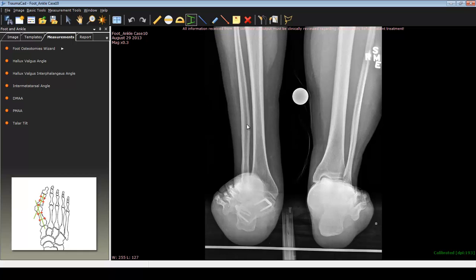So if you select the interline angle, let's look at the normal side. If you click on the normal side, you would see that there are certain measurements that are important when you're looking at this image, and that normally involves taking the calcaneal bisection of the heel bone with respect to the long axis of the tibia. And if we draw the long axis of the tibia, you see this ridiculous number comes up, 177 degrees, and that might confuse you, but all you have to do is switch these two lines around and you'll get a more acceptable angle that many of us are used to.